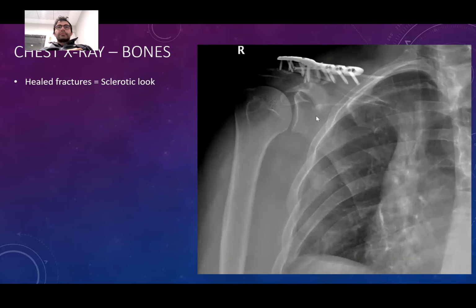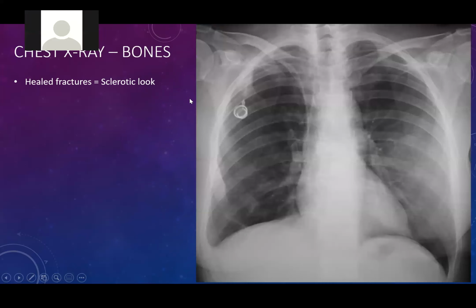And look at this one. So there's some prosthesis material on the clavicle. This is a very wrongly made X-ray, right? It's probably not a chest X-ray. This is something else. The end of the clavicle is here. The other clavicle is, I think, here. So there's an enormous amount of rotation. Does anybody see anything? We're seeing broken bones, right? Okay. All right. Let's have a look.